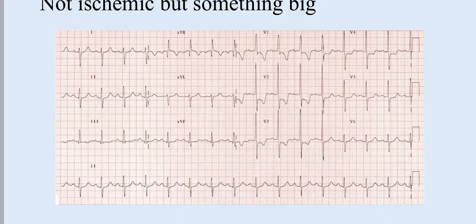And there are, of course, criteria for diagnosing RVH, and criteria for diagnosing LVH, which apply here so much. So I'm not going to go into detail, but this is RVH. My message here is that the T-wave inversion, the ST segment depression, all the manifestations of ischemia, can exist with other conditions which are non-ischemic. So you have to know which is which, okay?